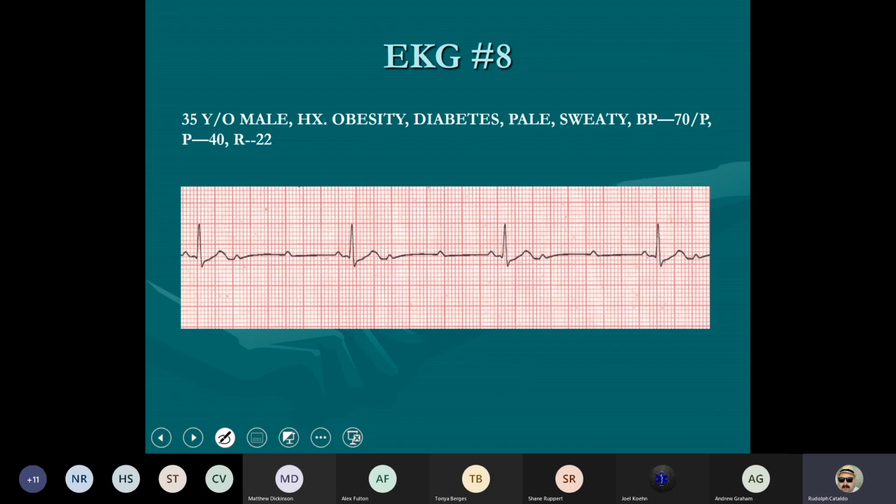All right. Ethan. I'm here. Tell me what we're looking at. 35-year-old. He's sinus bradycardia. Oh, never mind. He's in a 2nd-degree block. Okay, which one?